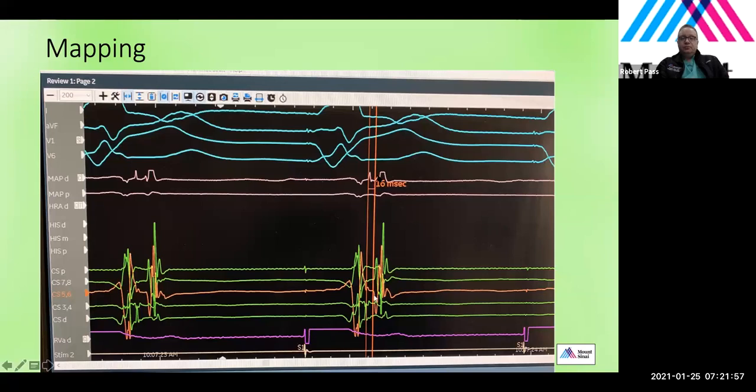And so what you see here on the distal ablation, I'm sorry, I clipped it by accident. You'll see that this is the ventricle signal and this is the atrial signal, and the retrograde A at the location of the ablation catheter was 16 milliseconds earlier than the earliest retrograde atrial electrogram in the coronary sinus. And that was the earliest site that we could identify in ventricular paced rhythm.